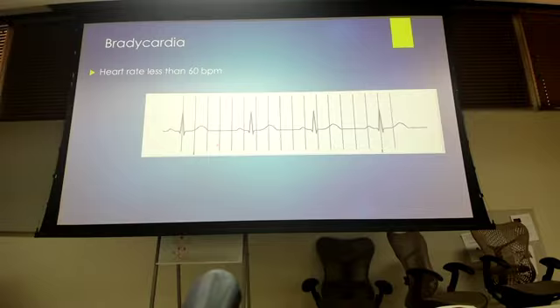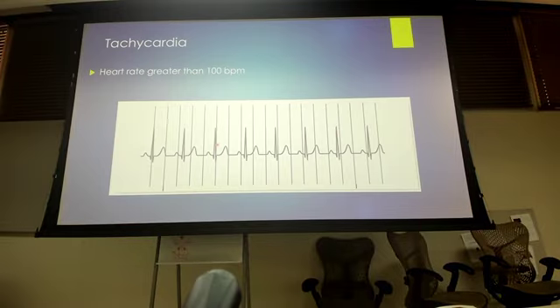Majority of stuff we'll look at on the exam is going to be part of that 10-second, that 12 lead ECG. Alrighty, so what about this? What about this heart rate? Okay, could we use the counting method for this heart rate?